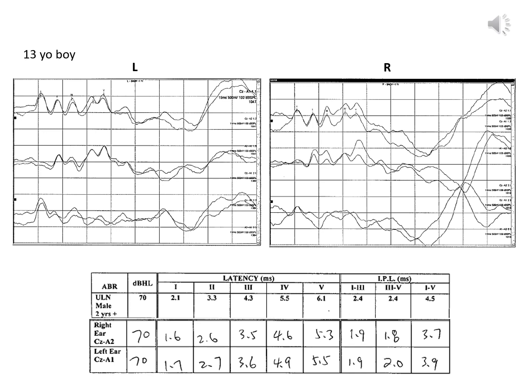Now, going down to the bottom part and the upper limits of normal, you'll note that this is recorded at 70 decibels. And the technologist has placed in the latencies for each of the waveforms. And so scanning across, you'll see that each of the waveforms are below the typed numbers, which are the upper limits of normal. And so because they're lower than the typed numbers, all the waveforms are normal.